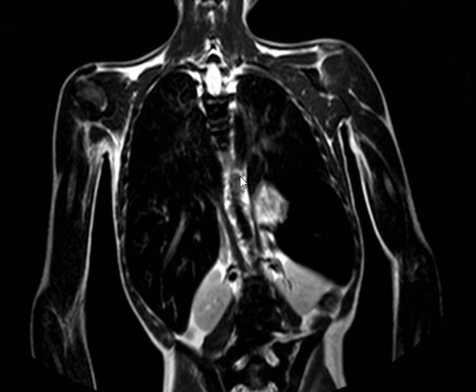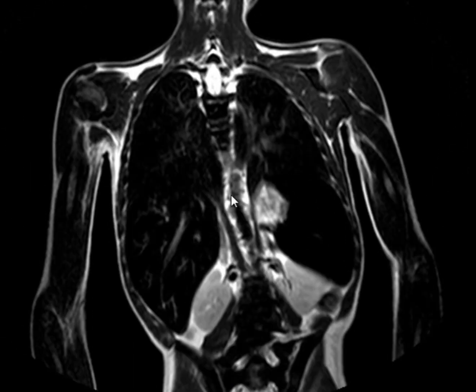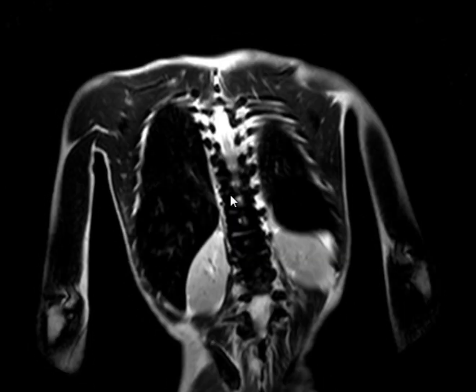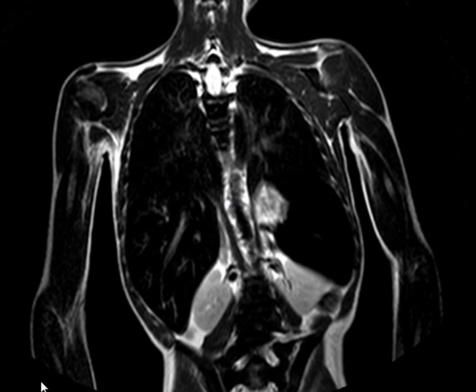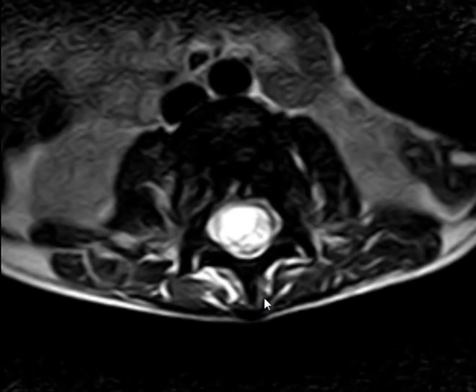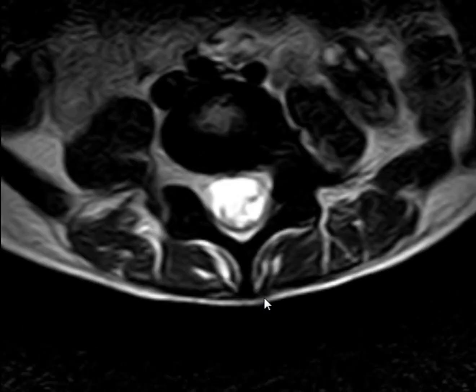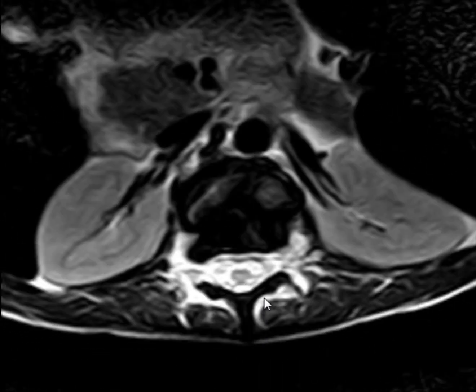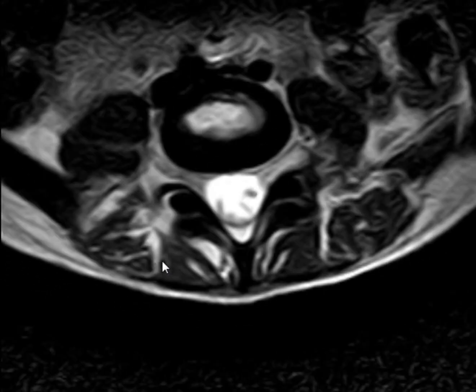Can you see any here? I don't remember the case, to be honest. Do we see anything that might suggest extramedullary hematopoiesis? Well, I don't think so. Let's go to the axial. It will be even easier, I think, to look for masses. Not clearly evident. And from the axial, you can see the enlarged spleen. Just see how big it is. So this is a case of what?